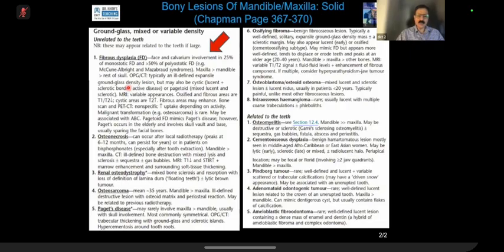Remember that. Now, there can be variable degree of secondary ossification. Please remember that we say that fibrous dysplasia has got a ground glass matrix, fine, but where you will be put off in your exam is that you forget that there can be other things.